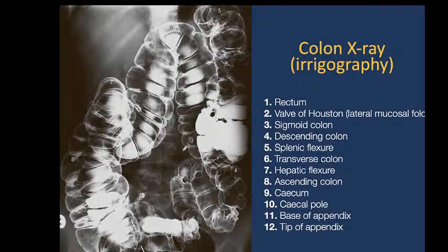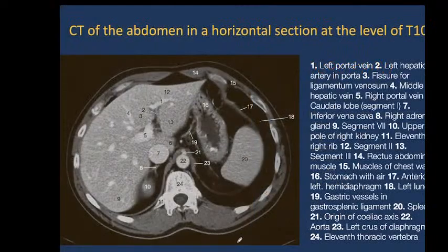If not, it means you are bad students and you don't know anatomy. So this is just air inside the colon, and all parts are well visible.